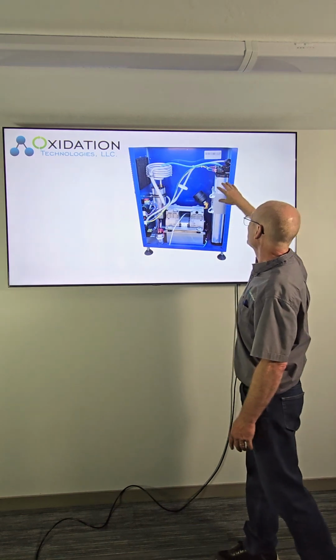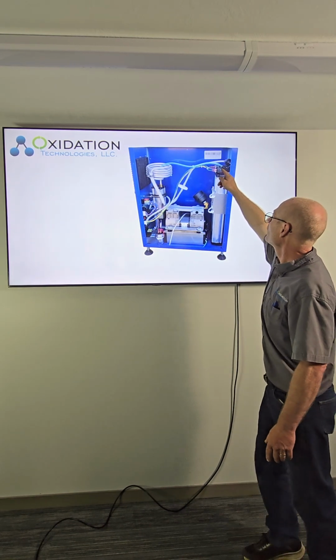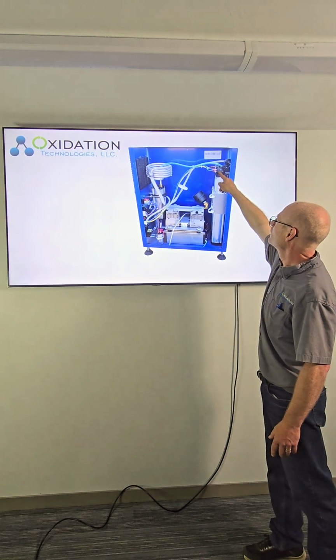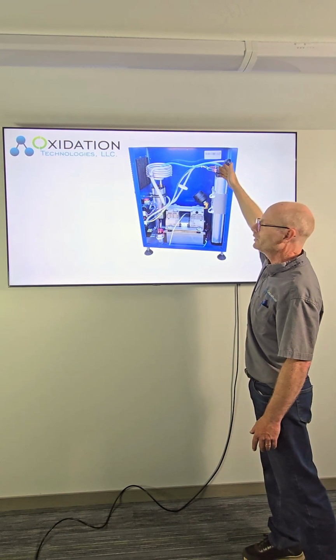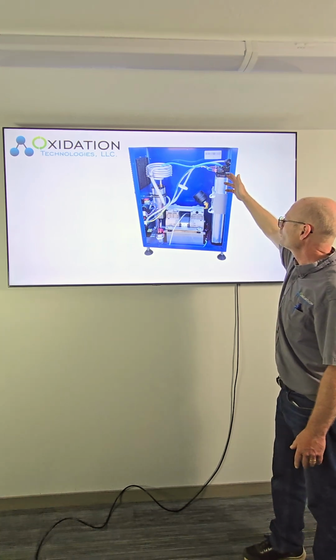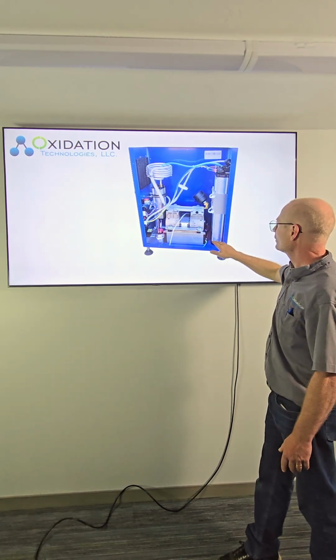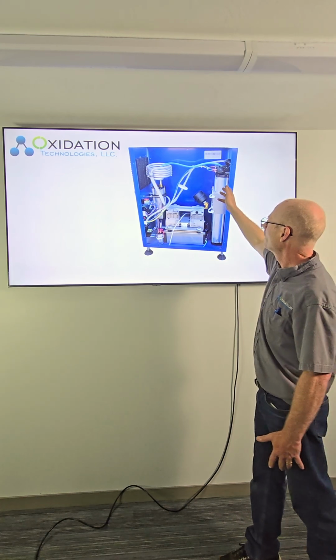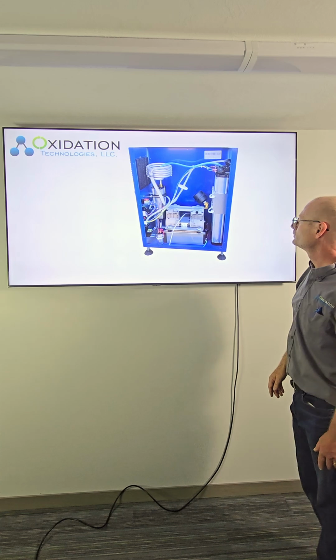We've got the air flowing in. This here is the timer. It's cycling back and forth. Here are two, the feed valve and the exhaust valve. They're actually built into one in this particular unit. And the check valves are built also into here. But the oxygen flows then out of the concentrator.